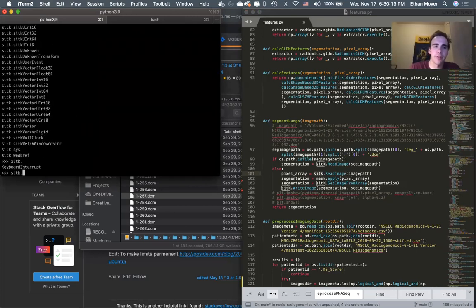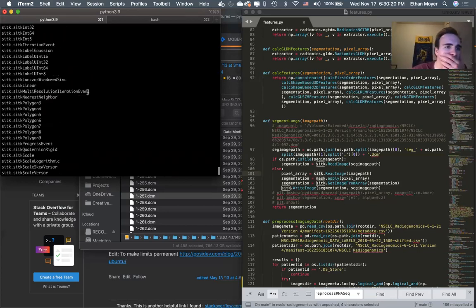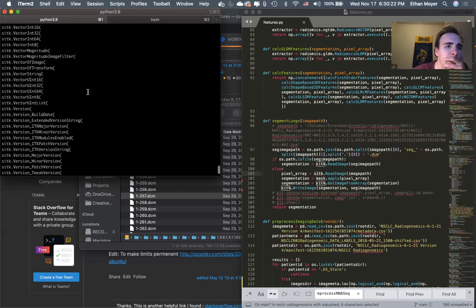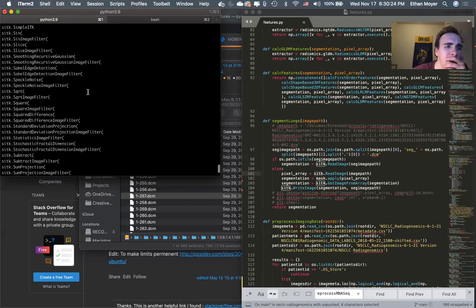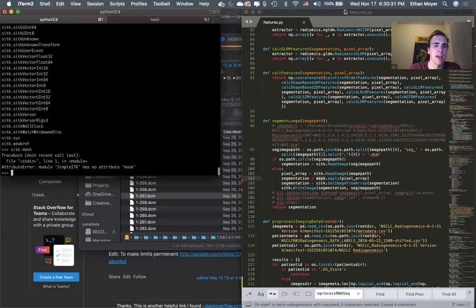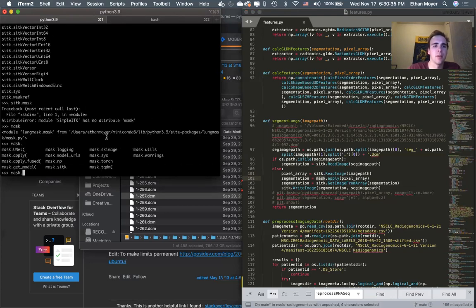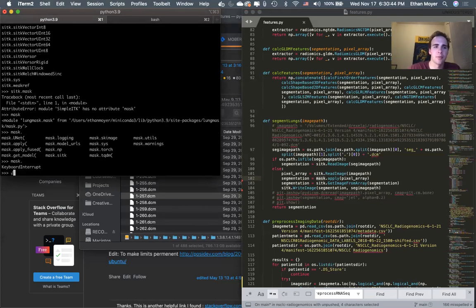The problem is I don't know what the file handle is. I don't know what controls the file handling of this, and it seems like it's in the mask apply. Is mask a static class that records all the files that have been used? I mean, that's a possibility.